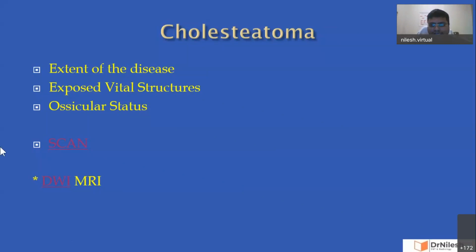If you know clinically or by contrast scan, like in that case, of facial nerve schwannoma, I have given contrast already. I know it is a contrast enhancing lesion, so it has to be facial nerve schwannoma. If you have doubt, then you have to get DWI imaging.